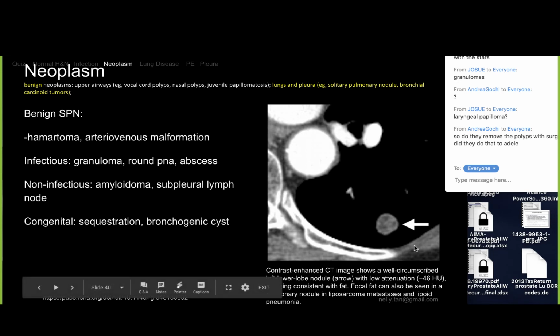Here you have the intercostal muscles and there's fat, that's the dark area. You have bone, and this one has contrast in the aorta. You can look at the attenuation. So here there's mixed attenuation. Some parts of it are black, some are a little bit more gray. And that black part looks like the black part of the fat. So this is a fat-containing lesion, and there's usually only one type, and that's called hamartoma. So that's a benign lesion when you see fat attenuation.